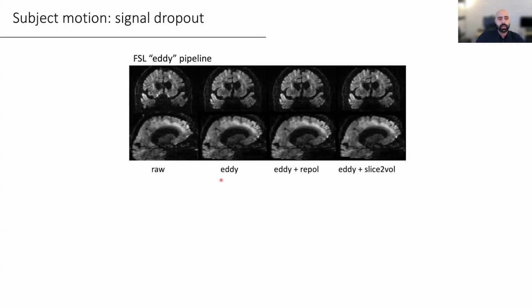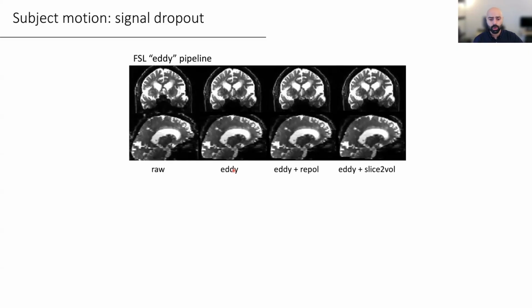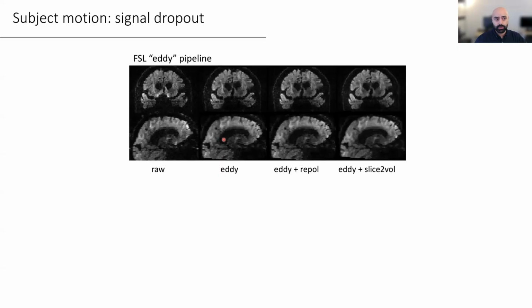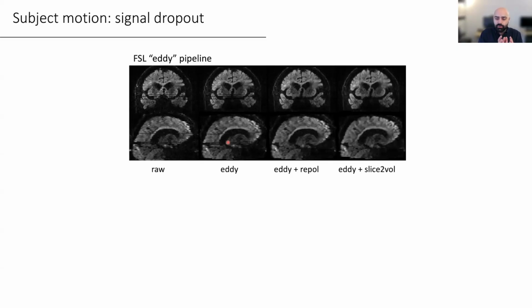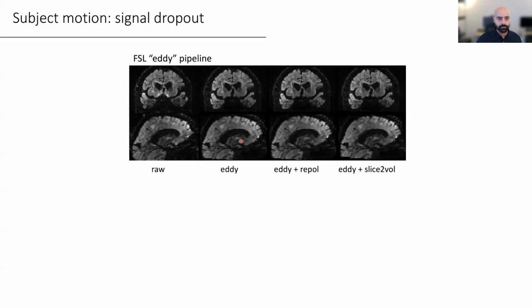Now, if we simply apply the main pipeline and correct for motion and eddy current distortions, but we don't correct for anything more subtle than this, we still see those effects present in the data. So this data, theoretically, in the second example, has been corrected for the main issues, but within every single volume that we acquired, within the data acquired for a diffusion gradient, that motion is still present, which means that the effect you see at the slice level has not been corrected.